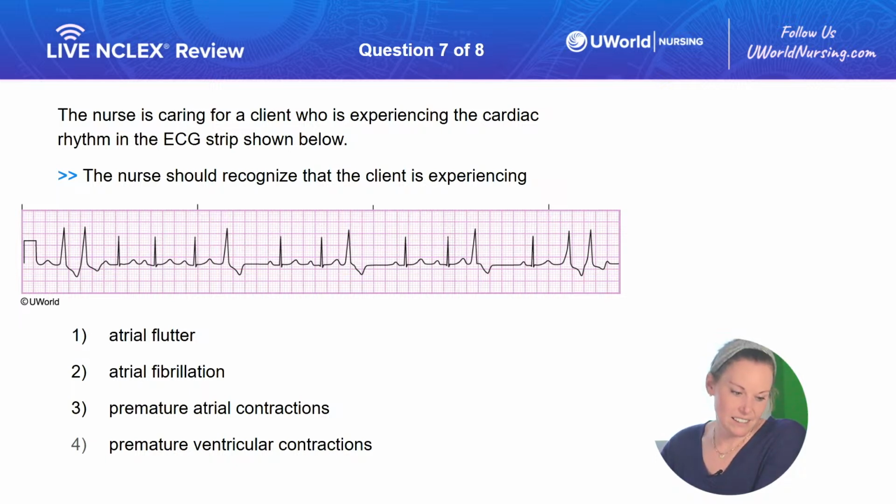All right, so let's see. I'm seeing a lot of option 4. That is very good. Y'all are doing great. Good job, you guys. Again, we can rule out some of these options. We know we've seen atrial fibrillation a couple times now. We can see coordinated atrial activity. We're seeing that P wave, that PR interval before our QRS complexes. It seems like we might be having a little bit of an issue with our ventricles based on the width of the QRS complex and how it has a little bit of disorganization. So I'm thinking this is definitely something ventricular, but we'll see.